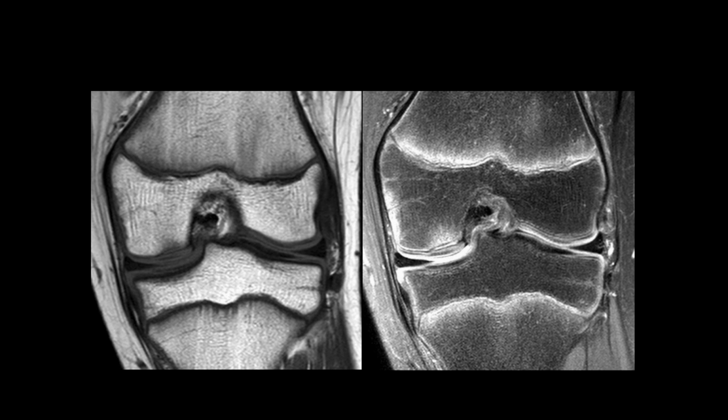Over again here. So here we can see that there's an osteochondral injury with the cleavage plane, the separation between the articular cartilage down here at the calcified layer with the underlying bone, where there's been a bone impaction here. And remember, I think we've discussed this before, articular cartilage is very pliable, so if you get an impaction injury, the bone is not. It's very rigid, so you can get impaction fractures of the trabecular bone, which we can see the indentation of the bone here, whereas the overlying cartilage is still intact, but we have a separation at the interface between the two, a relatively common injury, which we can see there.